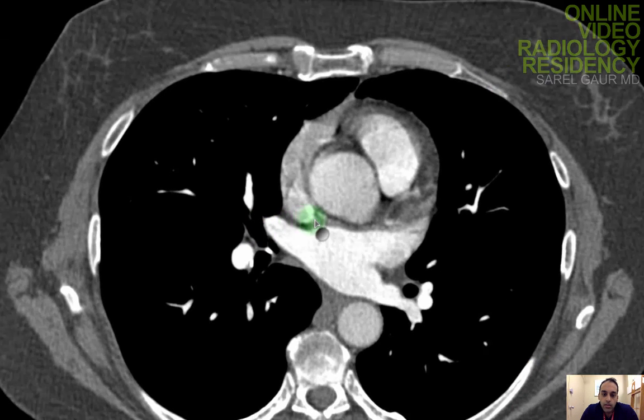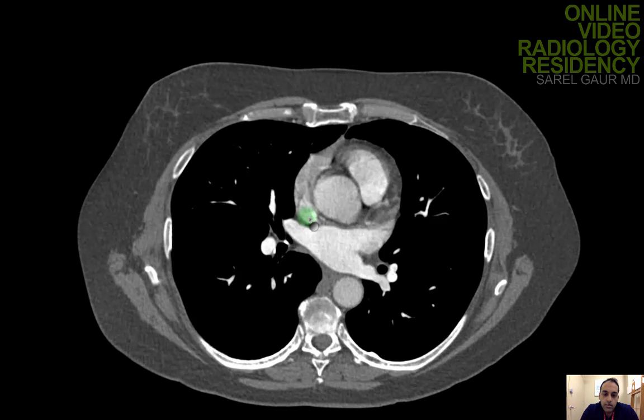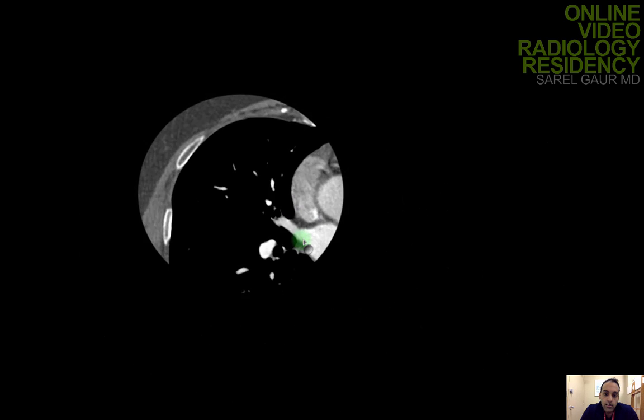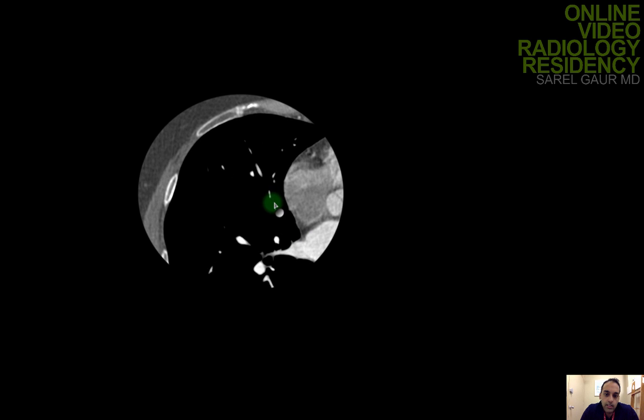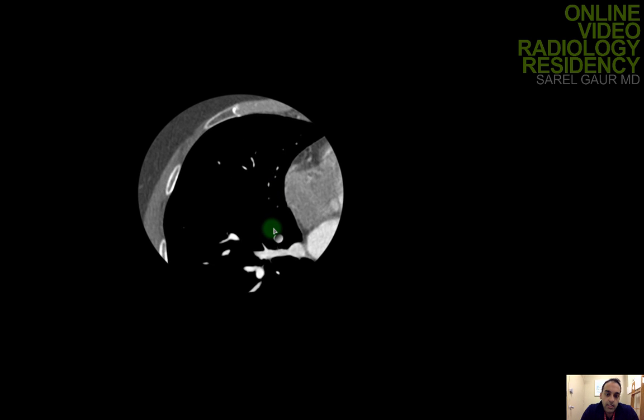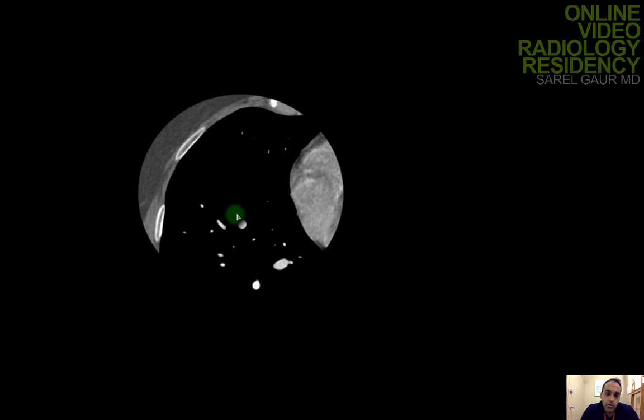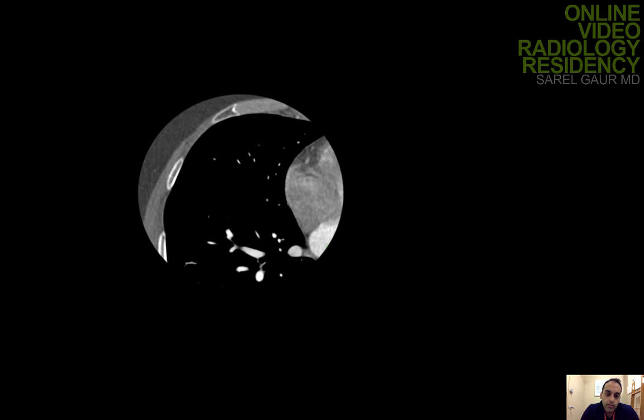Putting it back to the different window to look at the arteries. I'm basically looking at this artery and this artery, the middle lobe segmental arteries. And I'm just trying to look for any filling defects. And then I'm following out here, I'm looking for any subsegmental clots. Any areas of that contrast that doesn't fill, which would indicate an embolus. So I'm not seeing that.